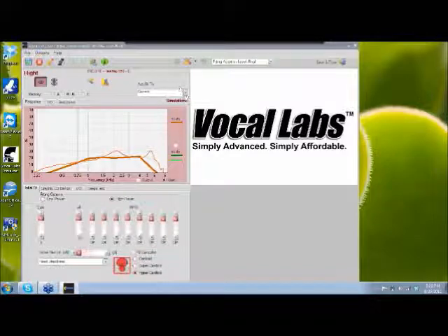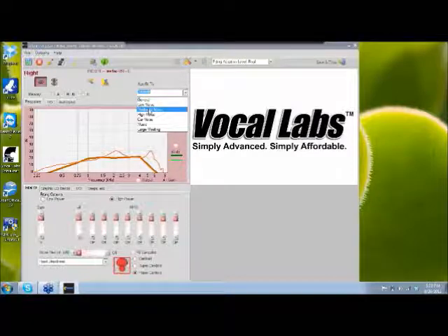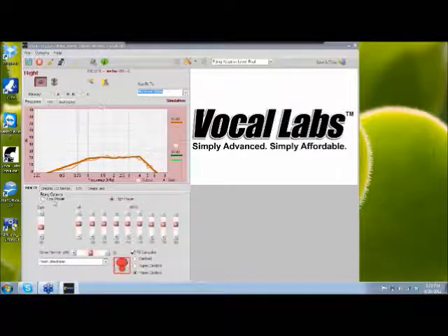But this time when we auto-fit our second memory, we would probably auto-fit to either a moderate noise or a high noise auto-fit program. What that does is it changes the compression ratios a little differently than a general noise environment to account for a noise situation. So I'm going to click on moderate noise here, and we've done a moderate noise auto-fit for the second memory. You can see the noise reduction is a step higher than it was in the first memory, okay?